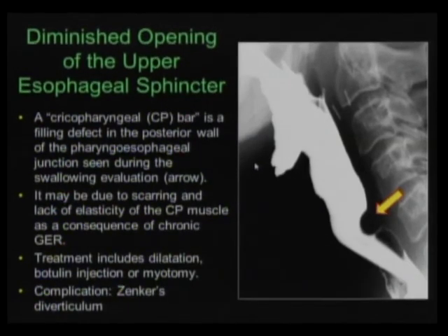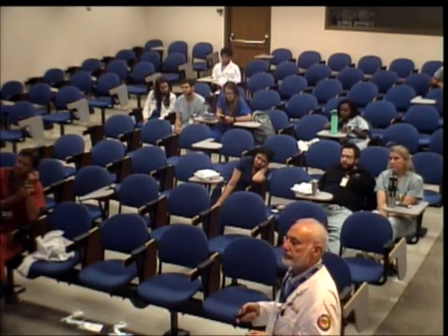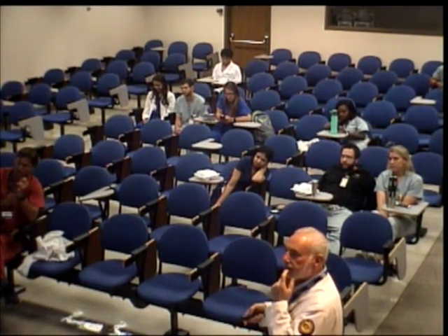Which was the image for ulceration? Sorry? Images for ulceration. Yes. This is one of them.